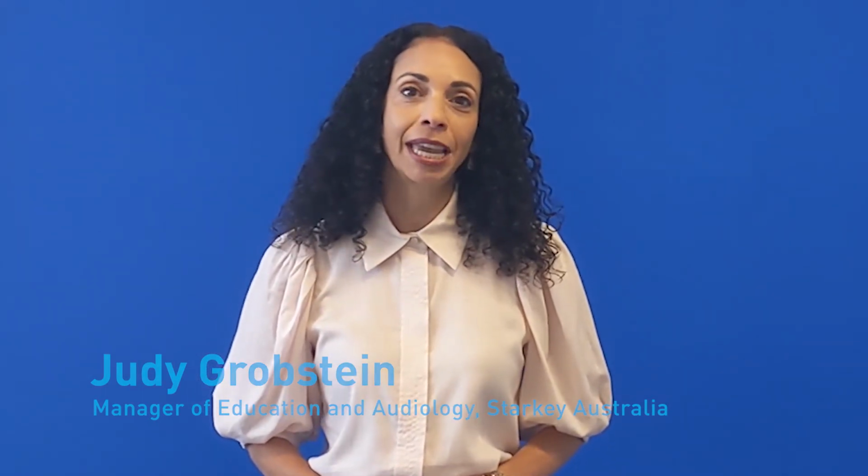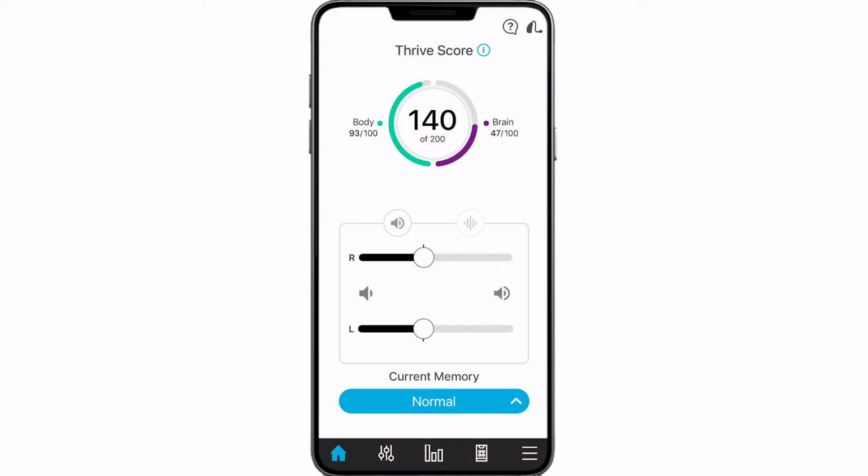And in today's Starkey at a Glance, I'm going to do a live demo of the Thrive mobile app. The home screen of the Thrive mobile app gives the user access to all of the most used features. Here, they'll be able to view their Thrive score, adjust the volume, change their memories, and have access to the bottom toolbar.